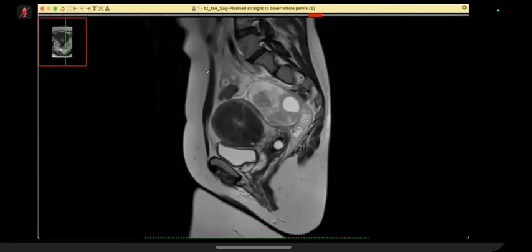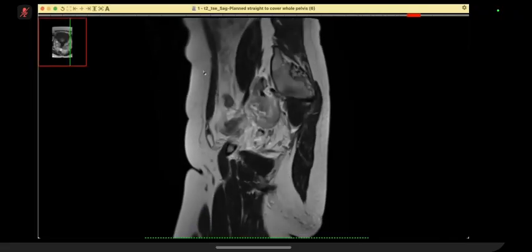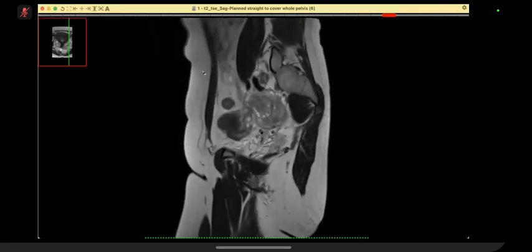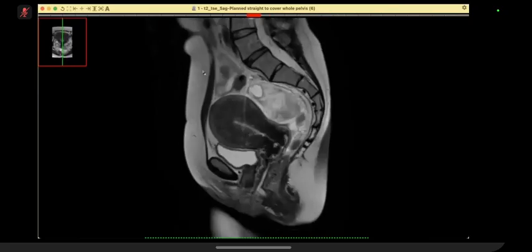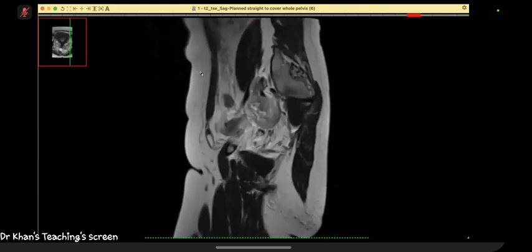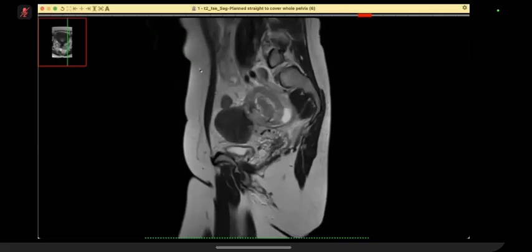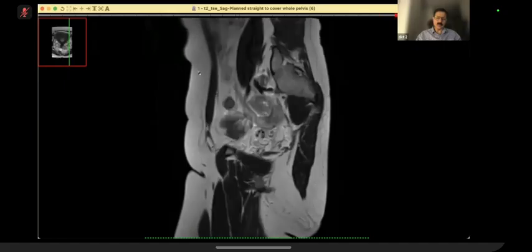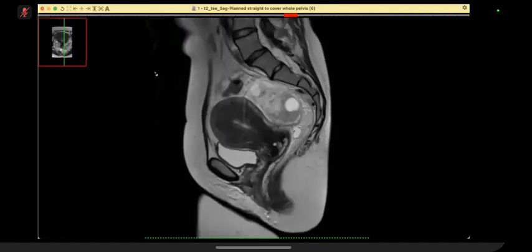There is a large oval shaped lesion seen in the Douglas pouch with the peripheral follicles and swirling seen around. This is confirmation of the ovarian torsion on the left side. I will urgently pick up the phone and inform the gynecologist immediately. So is it confirmed on this? You want to confirm, see another sequence also? It's okay to see the fat sat contrast.